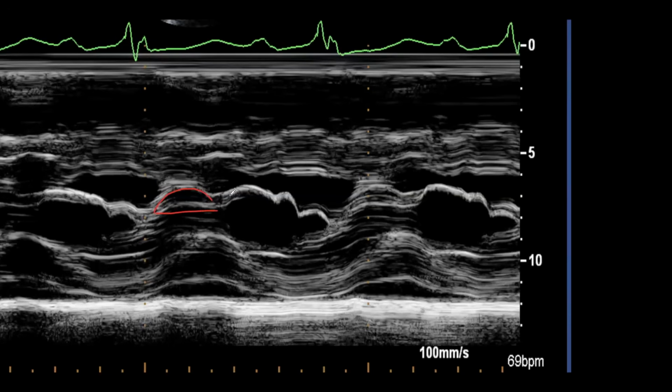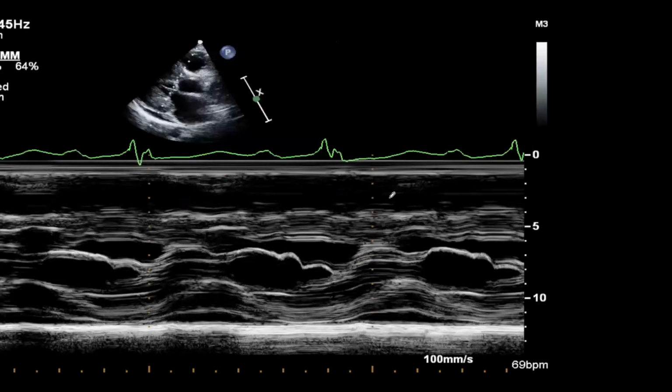So we have E, then we have A, which is here. Then we have this. What do we call it? Yeah, it could be. With the diastolic dysfunction, this patient could have a B bump or B hump. Any idea why we have SAM? What's the idea of SAM?